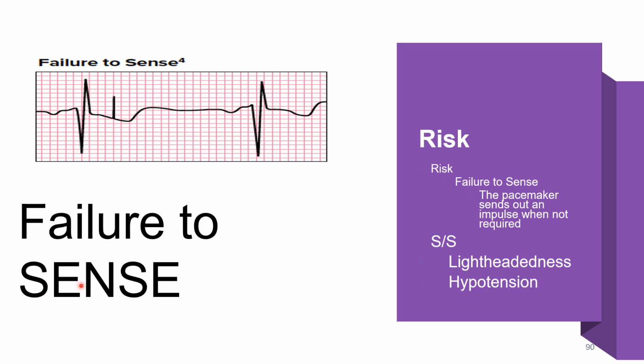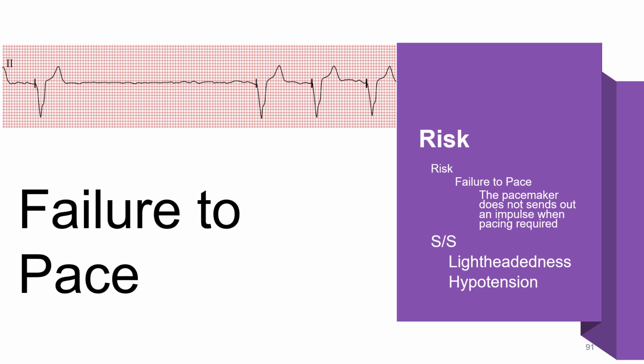Failure to sense. Again, it's not doing anything. It's just kind of wandering in space. Failure to pace. This looks beautiful, looks on time. However, this pacemaker failed to pace.